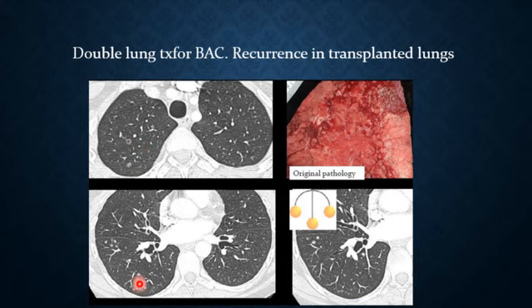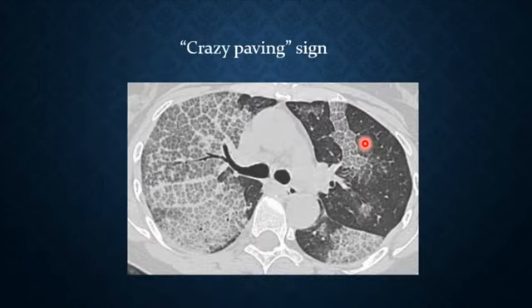And again, on another view, you can see the Cheerios and the pathology had a recurrence in the transplant lung, of course, due to the immune suppression and the radio and the chemo and things like that. All will exacerbate the possibility of developing another malignancy.